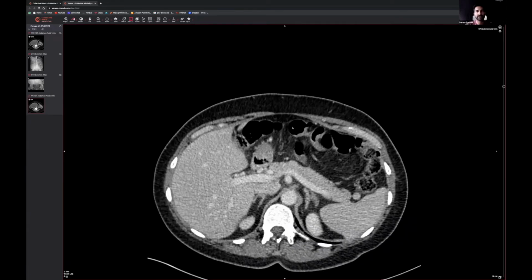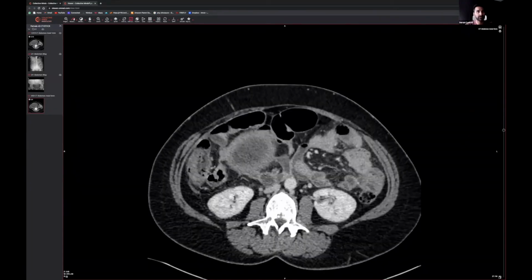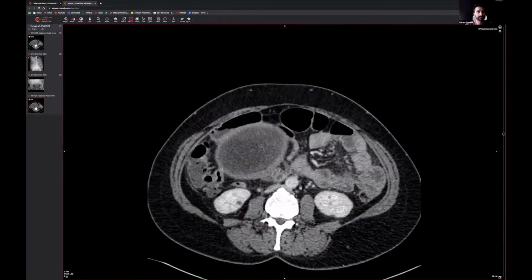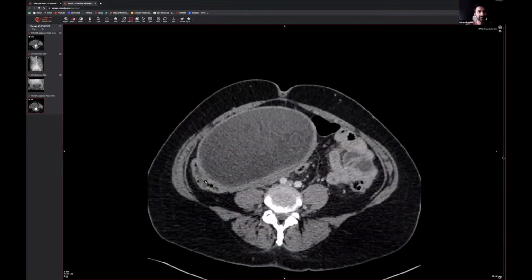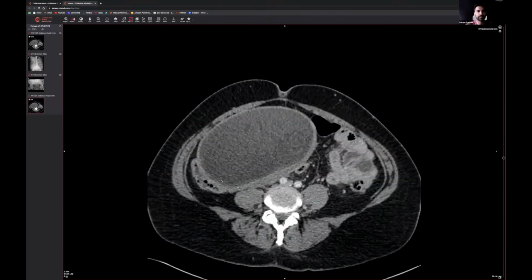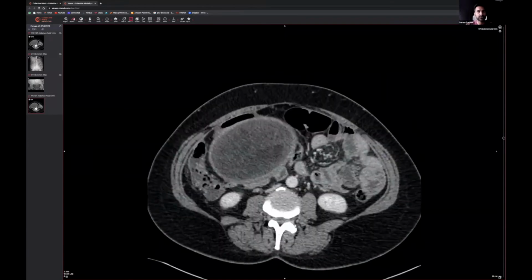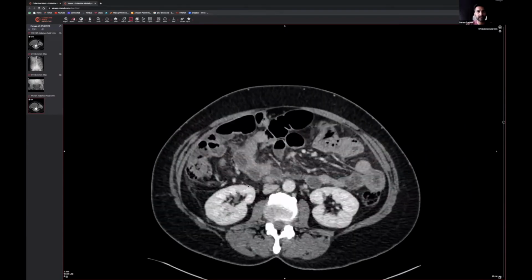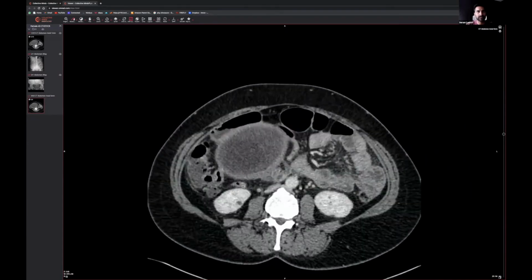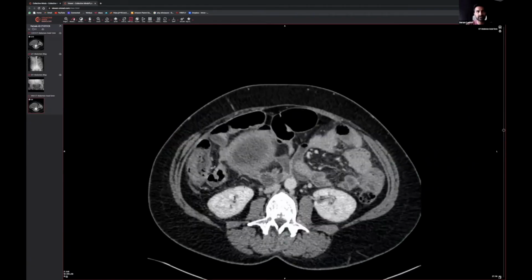You can see the bowel going right across the front like so. Now we're at the hepatic flexure. We're going all the way down, all the way down, all the way down. And you can see that this is a cecal pole sitting over here, but we can't really see a connection between the cecal pole and this lesion, right? And then you can see this tubular structure coming from this area over here and finishing. Can you see that one there, coming this way? It feels like it finishes, doesn't go anywhere else.